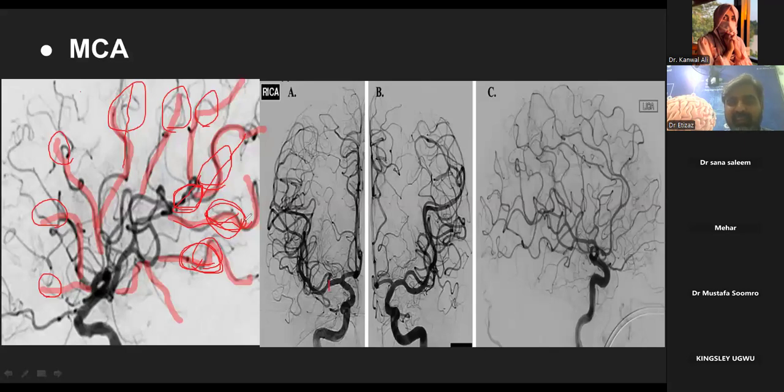This is an artery I think I also missed. It is some branch which also supplies the occipital area. This is the temporal. This is also a temporal artery. This is posterior temporal and this is anterior temporal artery. So by this way, somehow 80 to 90%, if you know the vascular structures and the normal anatomy, it will be easy for us to memorize.